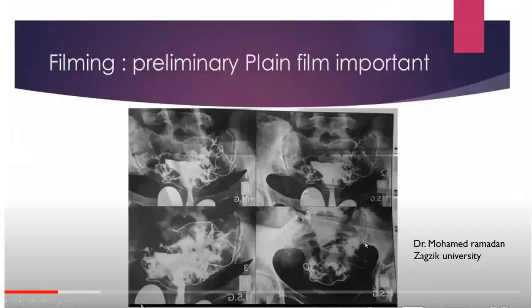Like this one, I got it from Facebook from our colleague. This was a hysterosalpingography, but no preliminary film was taken, and there is some mist-like shadow here, and there are irregularities present here all through. So please take a preliminary plain film.